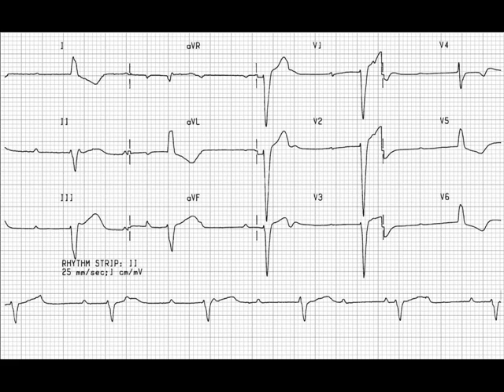If you look at the P wave that follows the first QRS complex in the rhythm strip, you'll see that the PR interval is too long. Look at the P wave before the third QRS complex, and the PR interval is even longer. Look at the P wave before the fourth QRS complex, and the PR interval is even longer. And then following the fourth QRS complex, you have a P wave on its own. It doesn't conduct down into the ventricles. There's no QRS complex following it. In fact, you get another P wave with a normal PR interval.